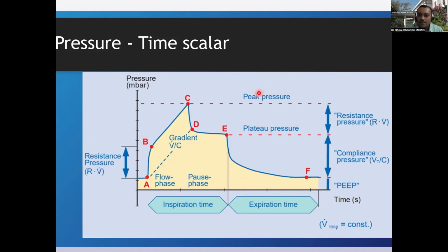Now another important concept is peak pressure and plateau pressure. Peak pressure combines the pressure of all things including plateau, and that will include your pressure to overcome the resistance of the airway conducting tubes, if any HME filter is there, or if you have put a small tube or all those things. Whereas plateau pressure represents your end alveolar pressure, and that is what our targets generally are.